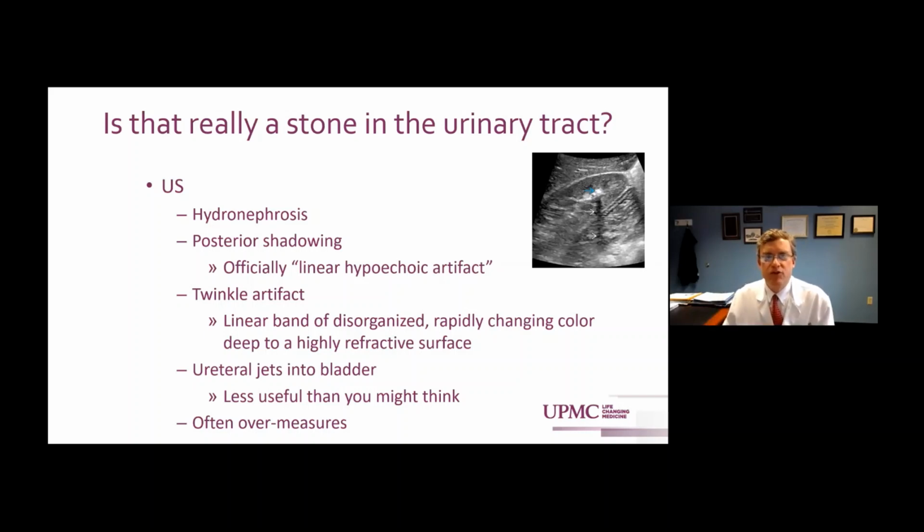Ultrasound, classically, of course, you're going to see the hydronephrosis. That's probably the most sensitive thing you'll see. But when you do see the stone, typically in the kidney, not so much in the ureter, you can see posterior shadowing, which even if you're looking for a ureteral stone, if they happen to have stones in the kidney, that strongly suggests that, yes, this is a patient with stones.